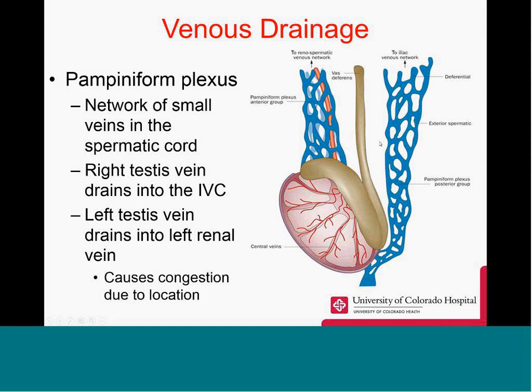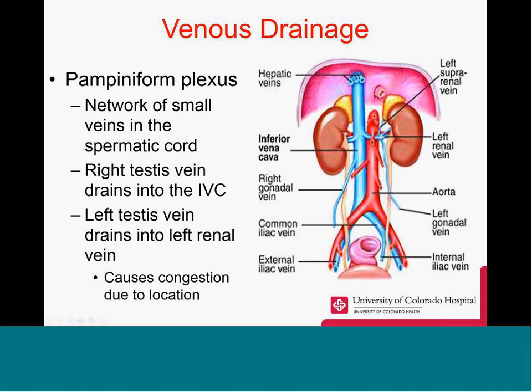The right testis vein does drain into the vena cava, you can see here. The left testis vein drains into the left renal vein. Because of this normal anatomy, it does cause a congestion due to this location of the left renal vein. So left-sided varicoceles are rather common.